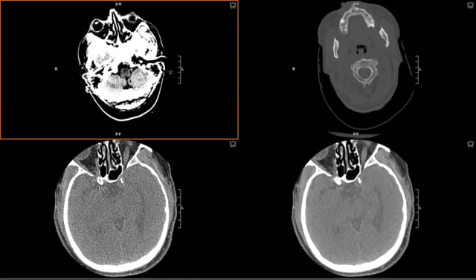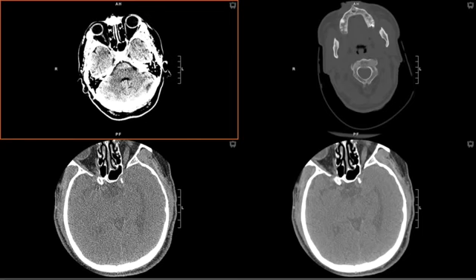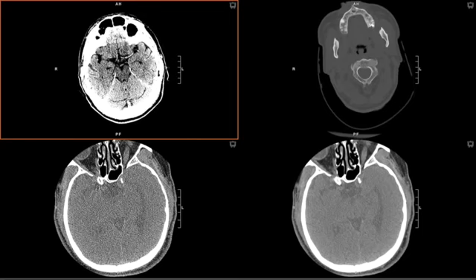Lastly, look at the brainstem. Be aware that there is a lot of artifact going through here as a result of the skull base, but you can catch subtle strokes if you look here every time.